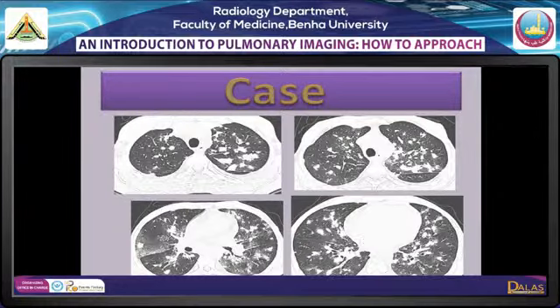اوكي زي ما حضراتكم شايفين هنا، or have pleural base. نمبر 4: في prominent bronchocentric interstitial، اللي هي البرونكس والارتري اللي جنبهم شكلهم prominent. فتاني الفليم شيبت اولا bilateral lesion.